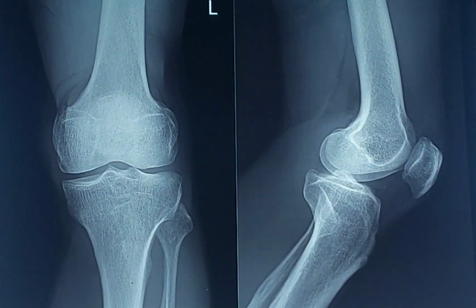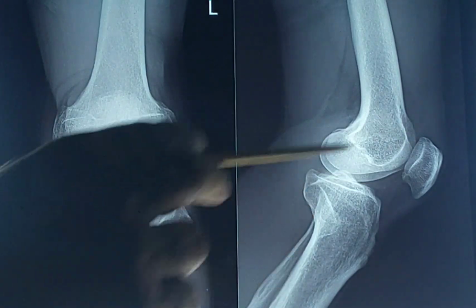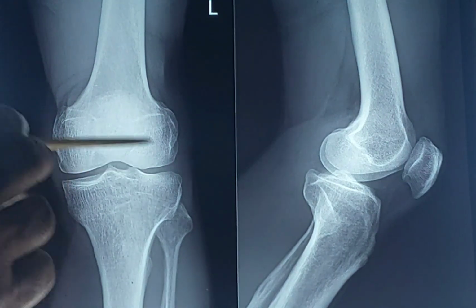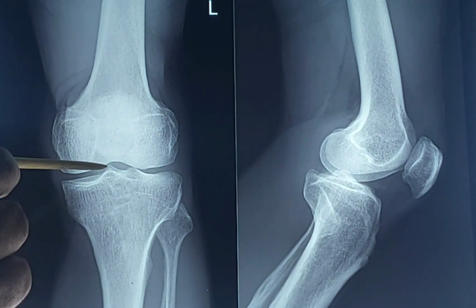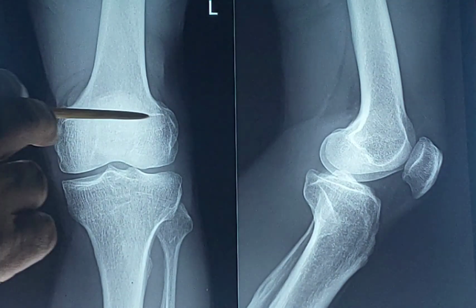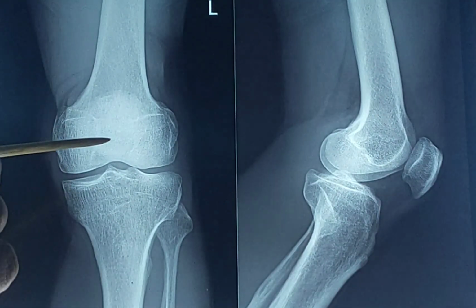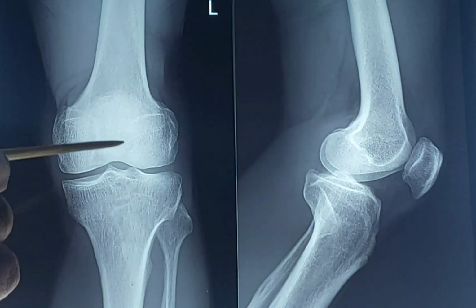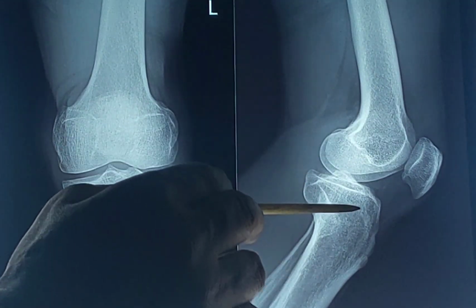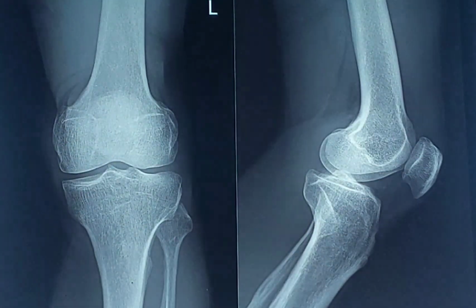Then what are the joints formed by these 1, 2, 3 and 4 bones? This is the knee joint and this is the joint space. That means here you will get the cartilage. Because cartilage is radiolucent, it looks black, and the type of the joint is the synovial joint. But the knee joint is not only formed by the tibia and femur, it is also formed by the patella. So tibia, femur and patella, these 3 bones form the knee joint.